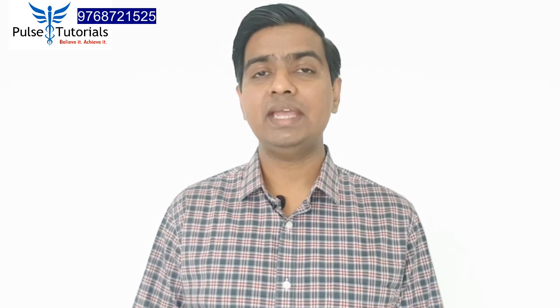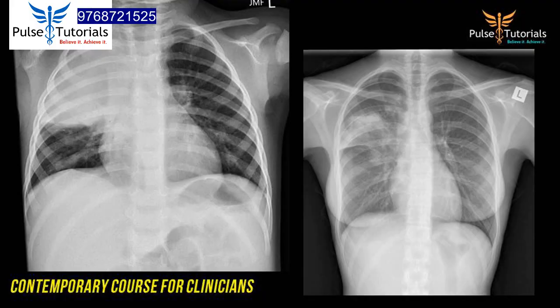Before we move on to everything else that remains to be seen on a chest X-ray, I would like to have a look at a few examples here. The examples will make it clear how you are supposed to read an X-ray. So this is the first X-ray I am showing you. Observe how in the X-ray film you notice an opacity in the right upper lobe of the lung. This is a classical case of right upper lobe consolidation, mostly pneumonia.